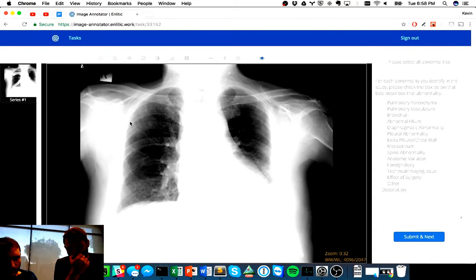So this is a case to demonstrate what you do when you don't know what to do. And when we labelled this, that's precisely what we did. And it's just the importance of knowing when to stop on the labelling system.